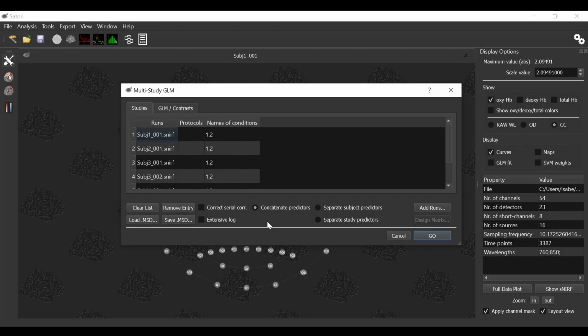Hello everyone! In this video, we will show you how to visualize the results of your multi-study or group GLM.